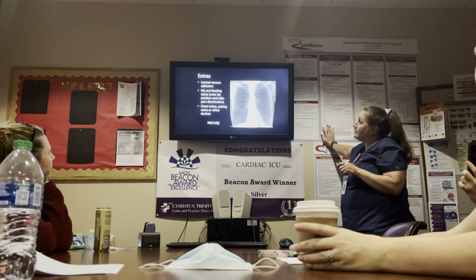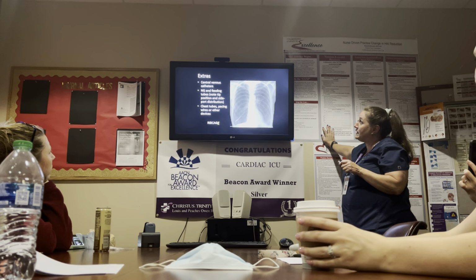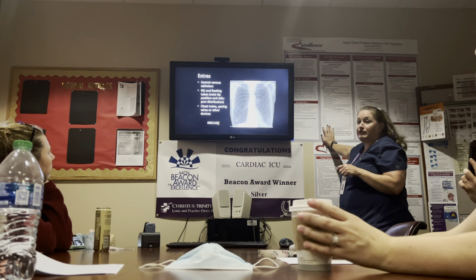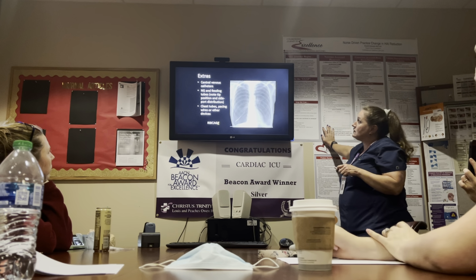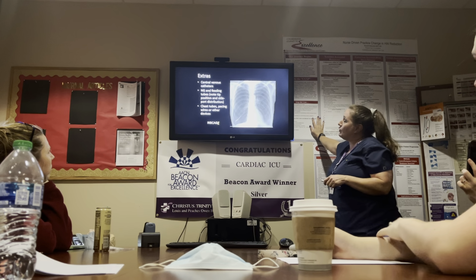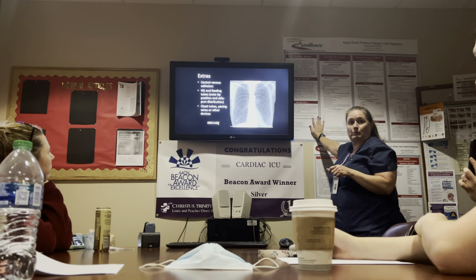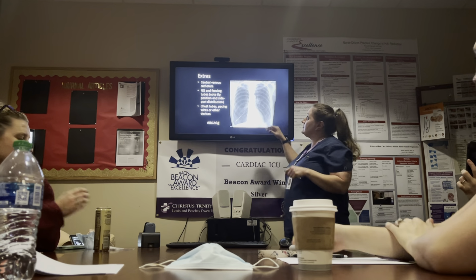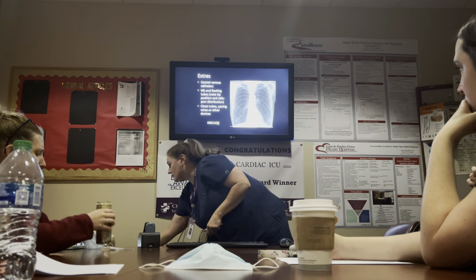You can tell that they're in extremis because there's expanded space between their rib spaces, and the lungs are hyperinflated. Okay, so the concern here is that this patient, and there's an endotracheal tube sitting right there, probably also needs to come off the ventilator and have his chest compressed to see if we can get that to kind of settle out. Okay, all right.